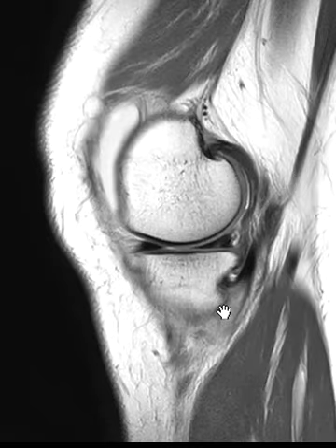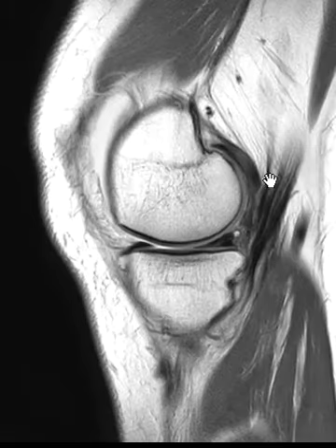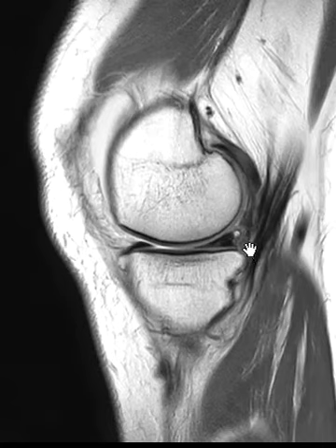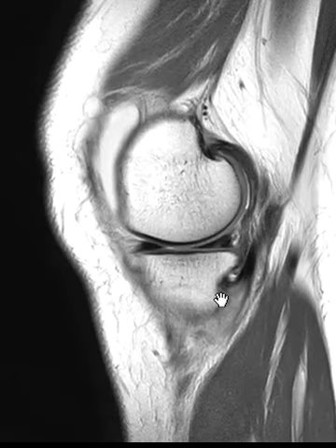It's something we don't see very often, but if we look in the posterior medial aspect of the knee, we see a tendon coming down here, the semimembranosus tendon. It comes down and attaches right back here. Often it'll be right next to the joint capsule, and they'll also injure the joint capsule or tear that when this is torn. But this is a tear along the inferior aspect, and this is associated with a tear of their medial collateral ligament or a sprain of the medial collateral ligament. And it comes down. We should see a nice dark attachment here, but instead we see this foggy brightness.